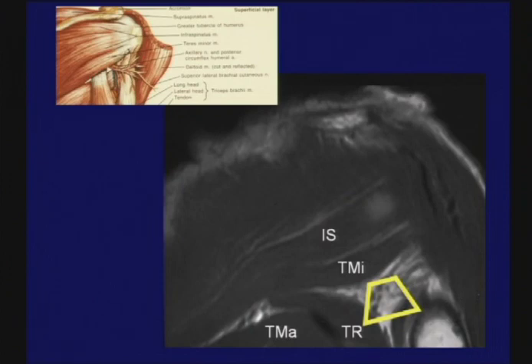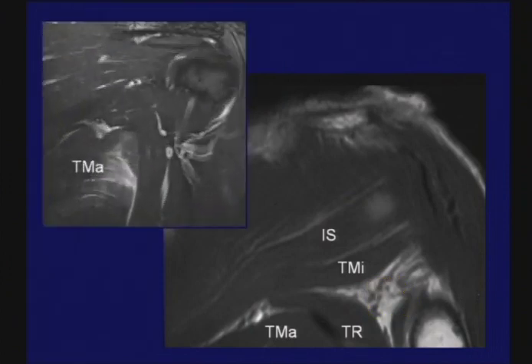And this can be useful because indeed you can see isolated muscle strains in one or several of these particular structures. Here, a teres major muscle strain, this is something we see in our professional baseball pitchers. So I like that as a landmark. When we study the quadrilateral space, we look for findings of the quadrilateral space syndrome.